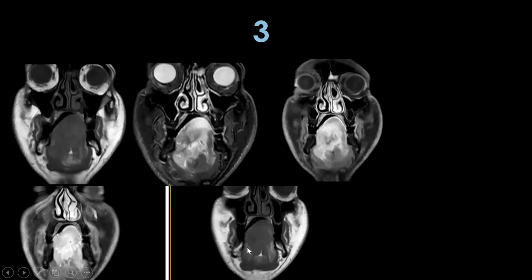There is no soft tissue in this region. There is some involvement of the sublingual region on the right side. In the posterior sections, I can see that the mylohyoid is involved on the right, but the left is free. So in this, it may not matter, but in early cases when there's just a right lateral lesion abutting the sublingual gland, we cannot say that it is reaching up to the floor of the mouth. So we can use an associated plain T1 scan to be sure about it.